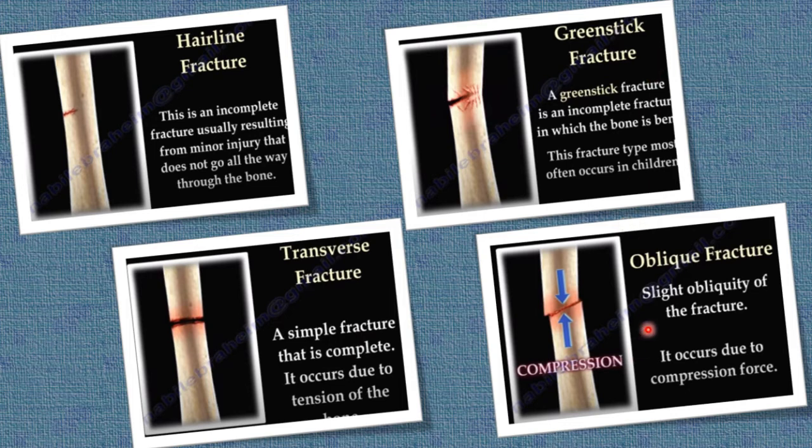Now this is the oblique fracture. You can see this was the transverse. This is sort of oblique fracture, right? Oblique fracture, slightly oblique of the fracture. The slight obliquity of the fracture occurs due to the compression force.